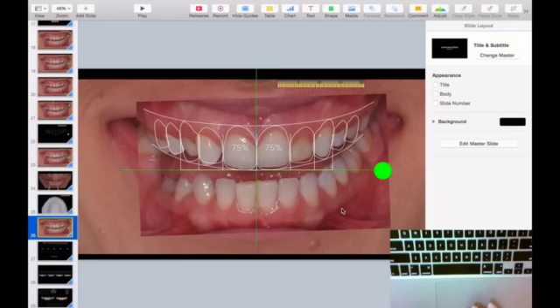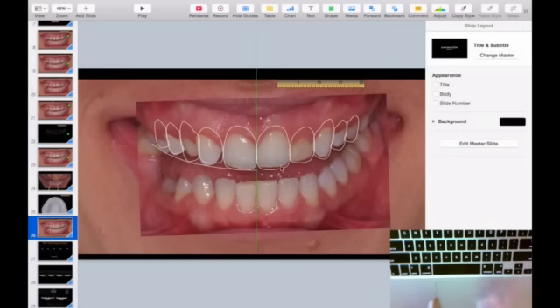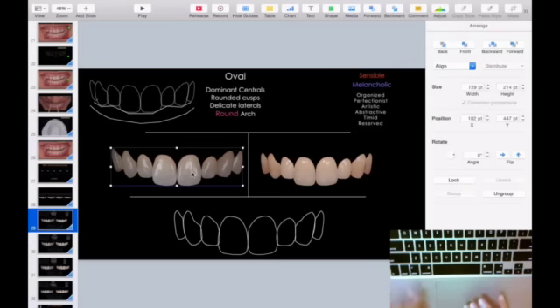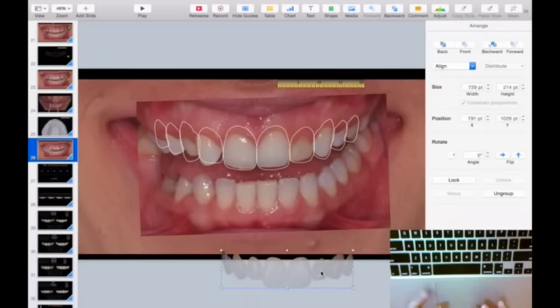So I'll get this picture that I have everything done. I'll take all this information out that I don't need anymore. And I'm gonna just leave what I need, which are the outlining of the teeth. So now I need to get the texture of this teeth. I can take the patient's own texture, or I can get this from my templates over here. I'm gonna pick this one. I think it's gonna be pretty good. And I paste it here.